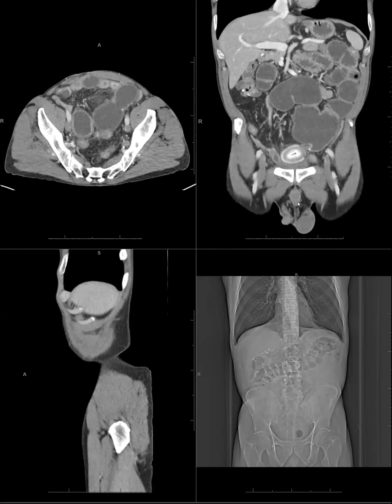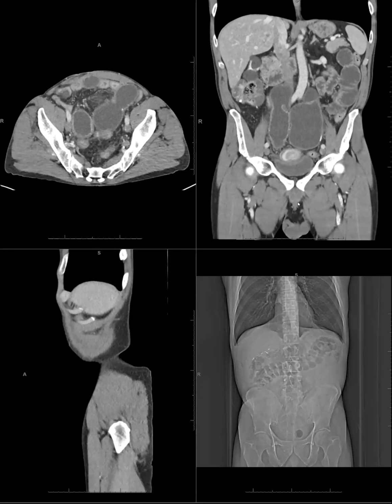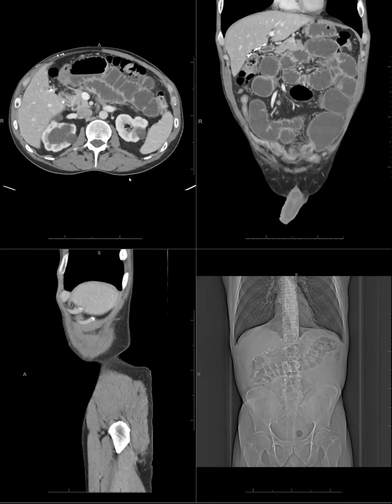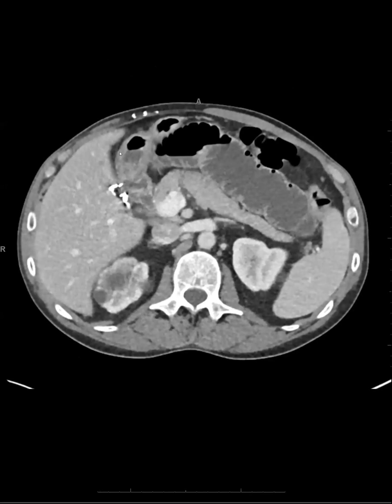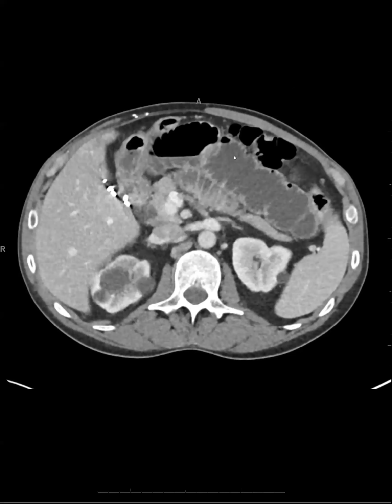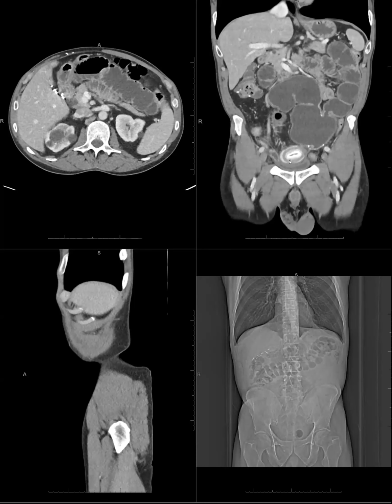So a bowel obstruction and a gallstone. So it's like maybe a gallstone ileus obstruction, but there are multiple sutures. Curious in that the gallbladder has been removed. Is it like an enterolith that just developed in situ, in the small bowel? That's basically the differential that I had, whether or not anastomosis, yeah.